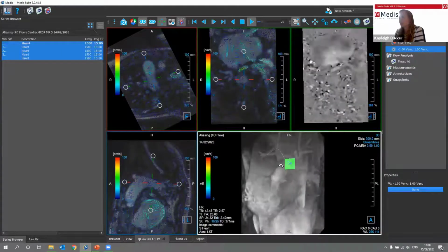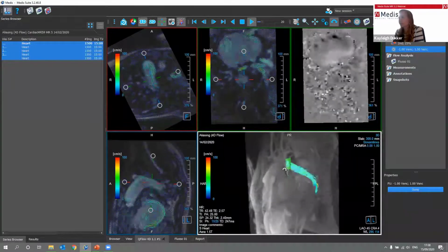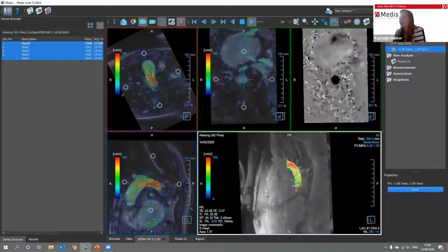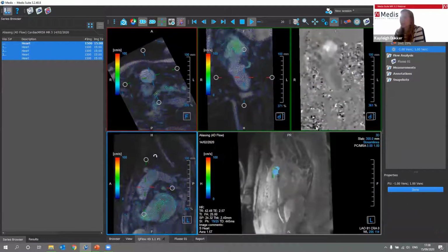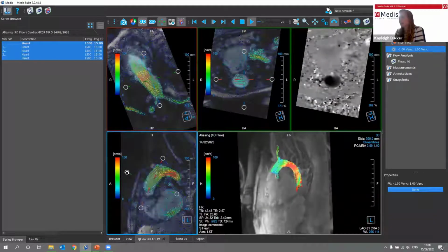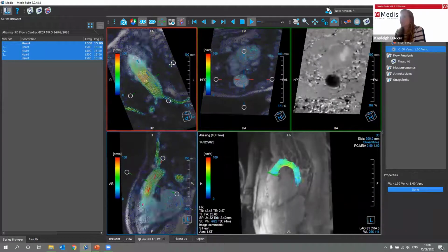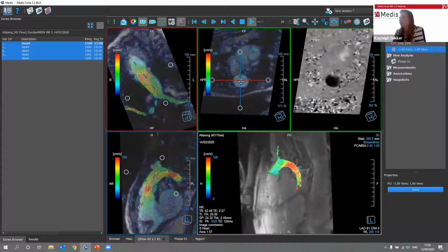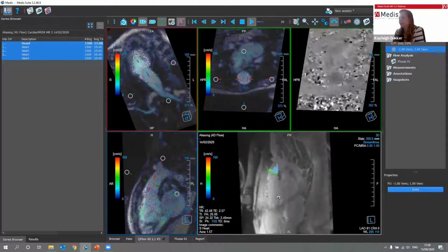So it's also why we are showing it here as your green plane. You can see here part of the aortic curve. We can still move our plane, of course. So if we want to see more of the ascending part of the aorta, we can still change the different locations and show you more of the whole arch of the aorta in there.